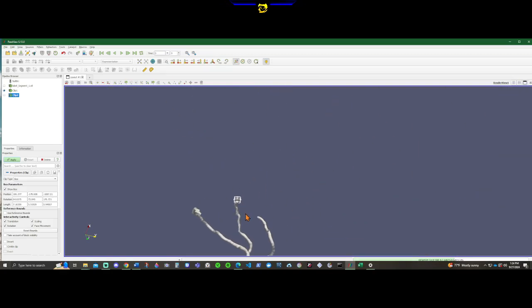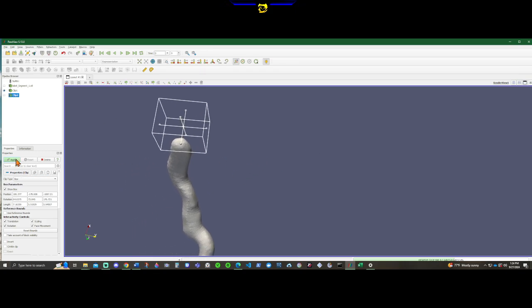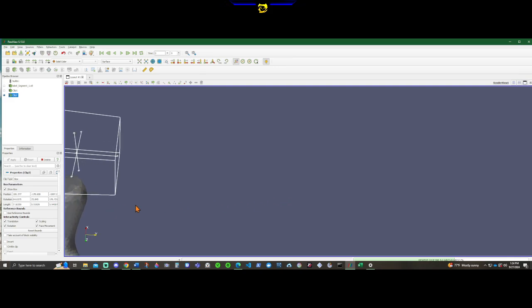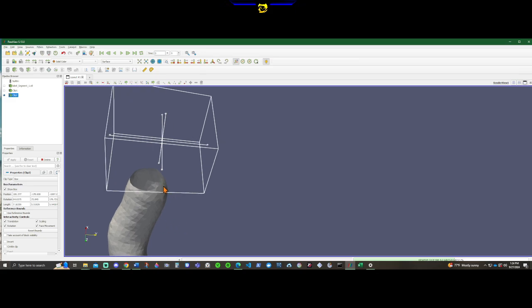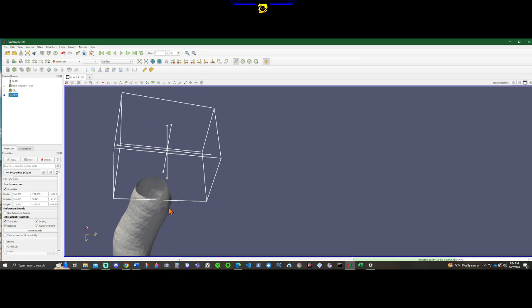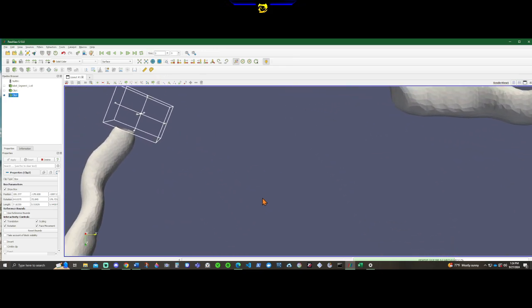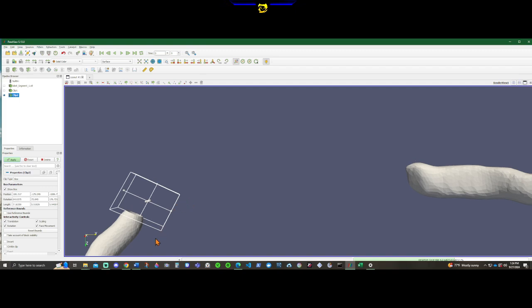Could be better, but you know, perfection is not really the goal. It's to get as close as you can, but you don't want to waste too much time trying to get it super perfect. So yeah, that's done, but I don't really like it. I don't like how there's this sort of extra little place. So I'll spend some more time right now in case you feel the same way. So I'll just drag it down a little bit more just to get rid of that corner.